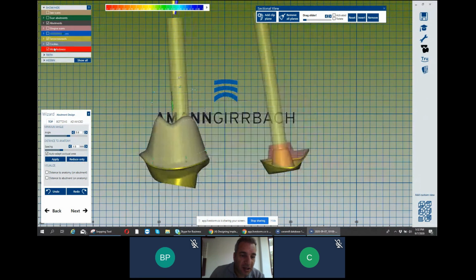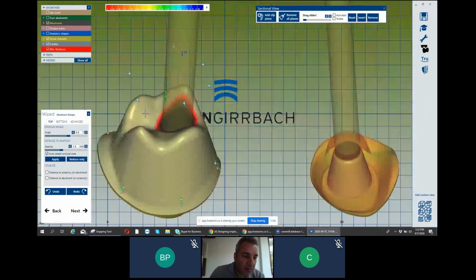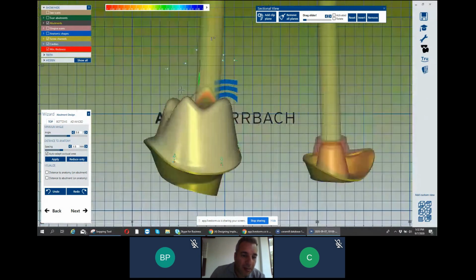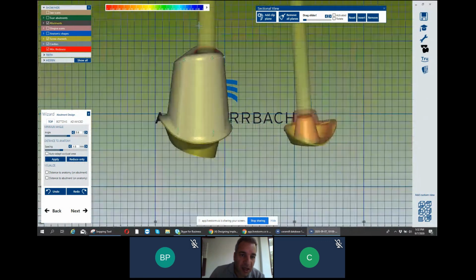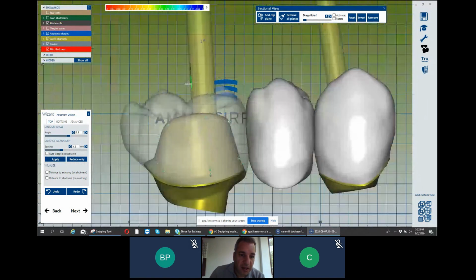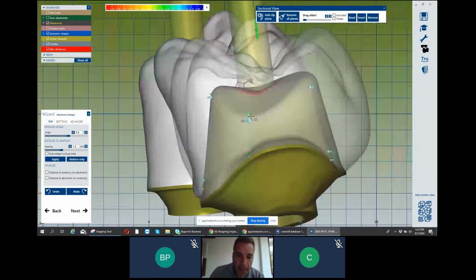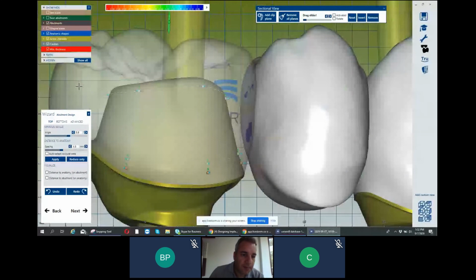But here, you see the shape of your abutment will be the same as the crown, which is not easy to fit. That's why I don't like this shape. We prefer always to have this shape and we adjust it to have the shape of the abutment. Okay, to shape the abutment, we will do it manually. Move this up. I can move it extra maximum like this.